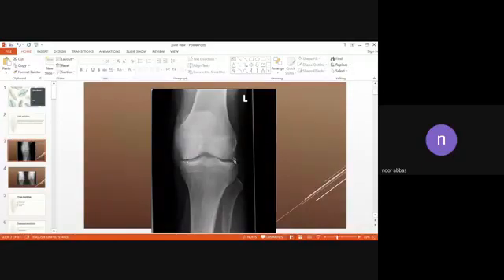This is a normal joint space. This is the left knee joint. This is the articular cortex of the femur, and this is the articular cortex of the tibia. And this is the normal articular cortex, which is smooth. This is the joint line. وهذا اللوسنسي اللي نشوفه on plain radiograph. It is formed by the cartilage lining the joint space and the intra-articular lucent structures such as the menisci and the ligaments.